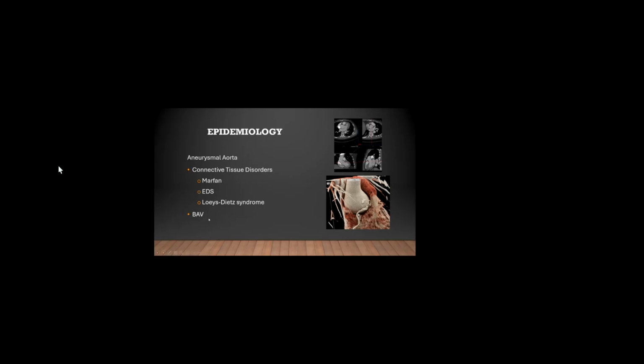Sometimes it's an aortic valve disease, for example, the bicuspid aortic valve, which changes the direction of the flow. Instead of being streamlined, it becomes helical flow. The helical flow leads to pressure points or shear stress at certain points in the ascending thoracic aorta, and it starts to dilate. For example, in this image, we can see that the aortic root is markedly dilated, and that is a bicuspid aortic valve. Maybe it's a small picture, but that would be the left atrium, that would be the right atrium.